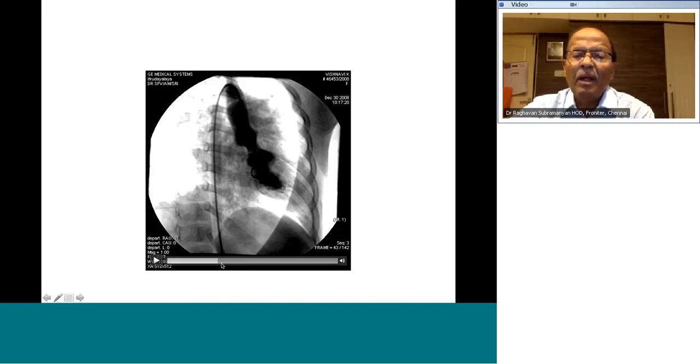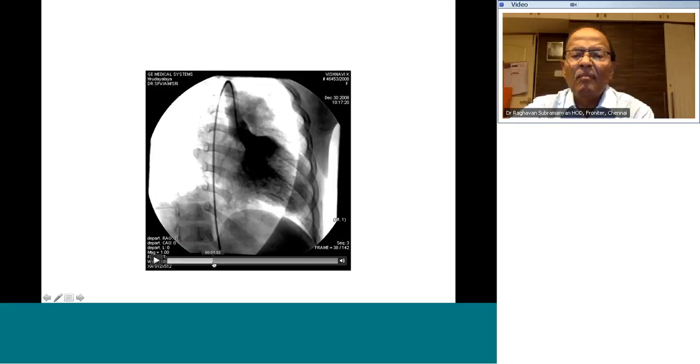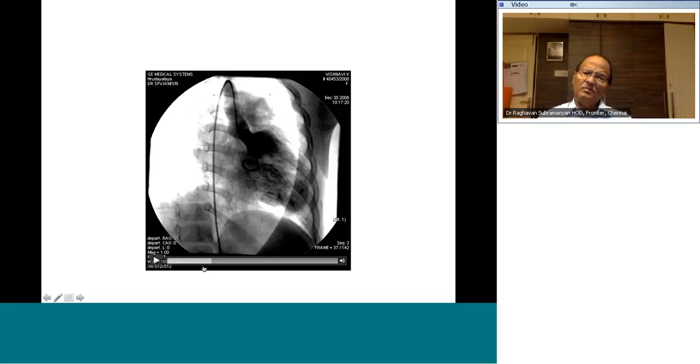Okay, and now I'm going to the diastolic frame. Right, that's the diastolic frame. Anybody want to talk about it?